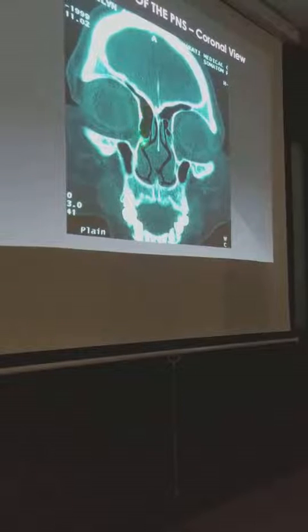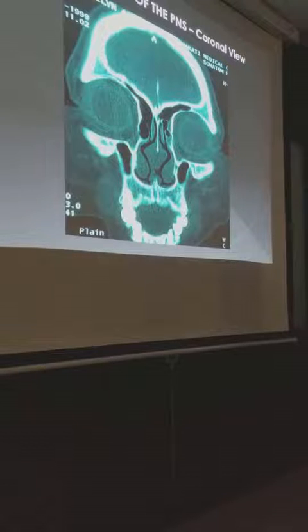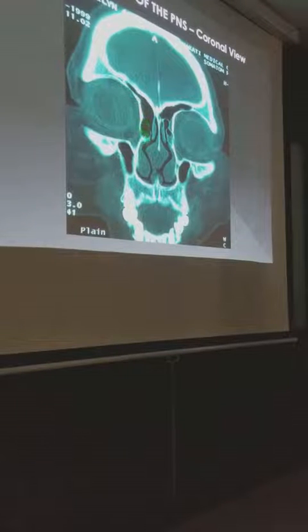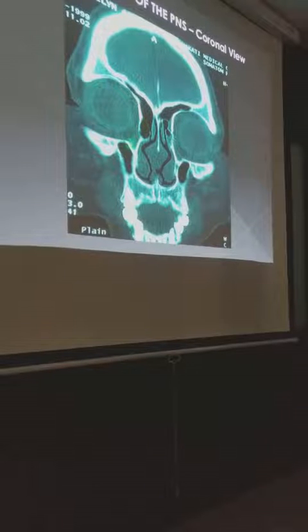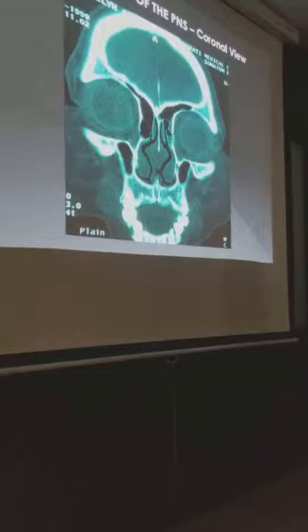Okay. Now, laterally, this is the relation. What is this? This is your lacrimal fossa. Okay. So the lateral wall of your agger nasi is also the medial wall of your lacrimal fossa. Understand? See? So, yun importante.